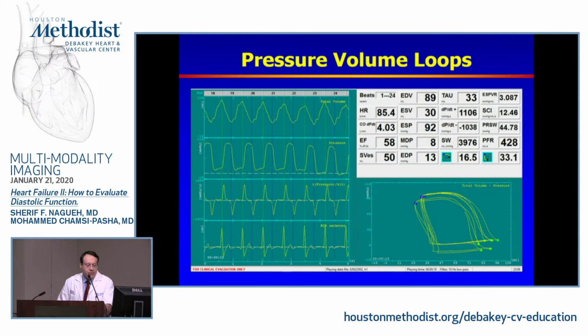That's an example of pressure-volume loops that can be done invasively with catheters in the ventricle. We have work we're doing with our heart failure colleagues and transplant patients, and it shows you a lot of data that can be obtained. Many of this data is invasive and it's systolic, but also several are diastolic. Dr. Prim is doing this research project, and we are hopeful we can gain new insights.